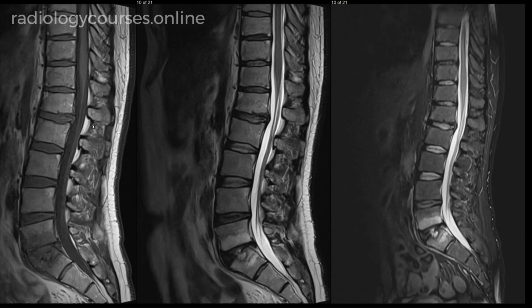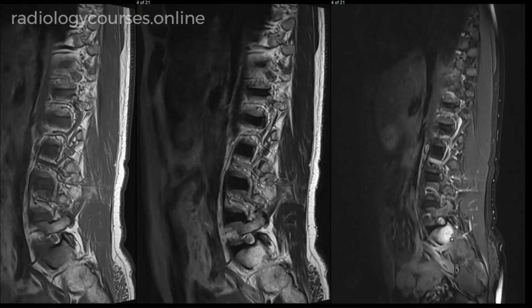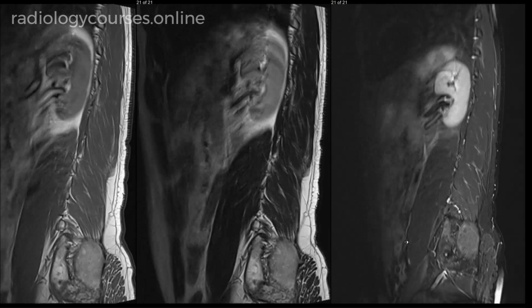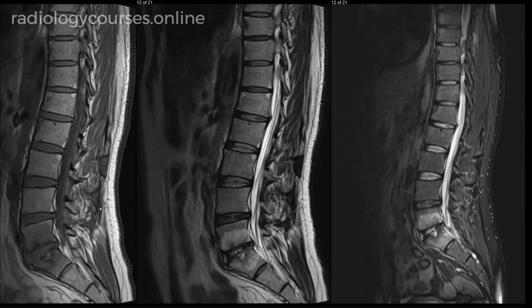With these findings, along with the L5S1 end plate degenerative changes, we need to now start considering could this be inflammatory arthritis. So we need to go to the edges of the film on the lumbar spine and we can see there is abnormal signal on both sides of the edge of the images, especially on the sagittal STIR sequences, which is highly indicative of active bilateral sacroiliitis.